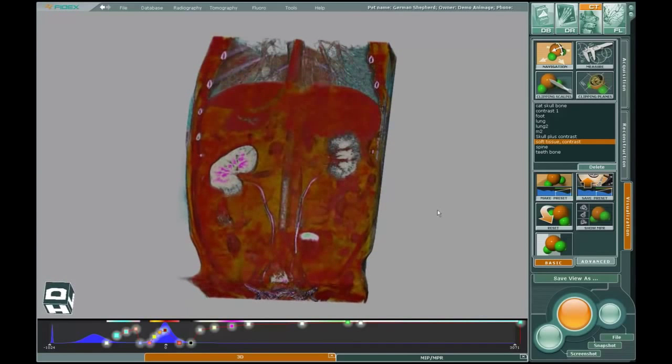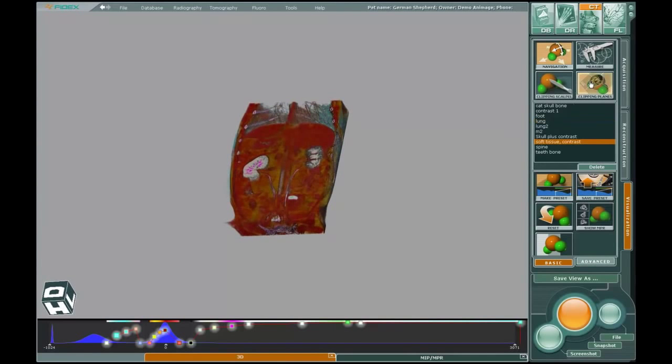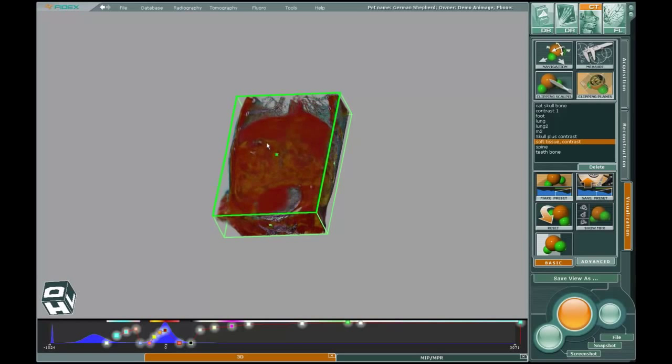Cut planes are often used to cut away image parts that may be obscured or may obscure what is of interest. Select clipping planes in the right screen. Grab the desired plane by its midpoint, wait till it highlights, and move perpendicular to its surface.